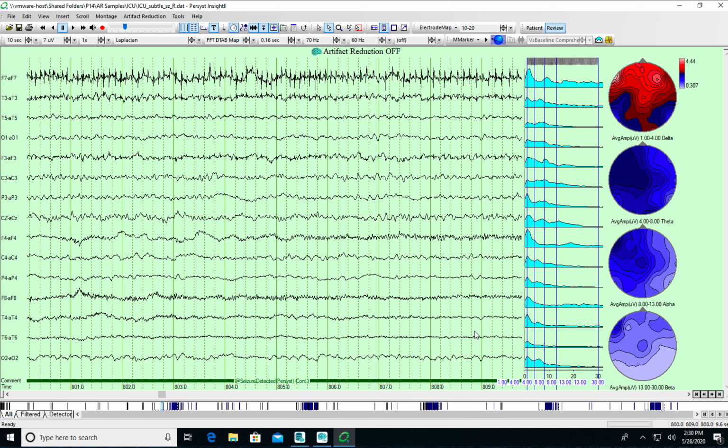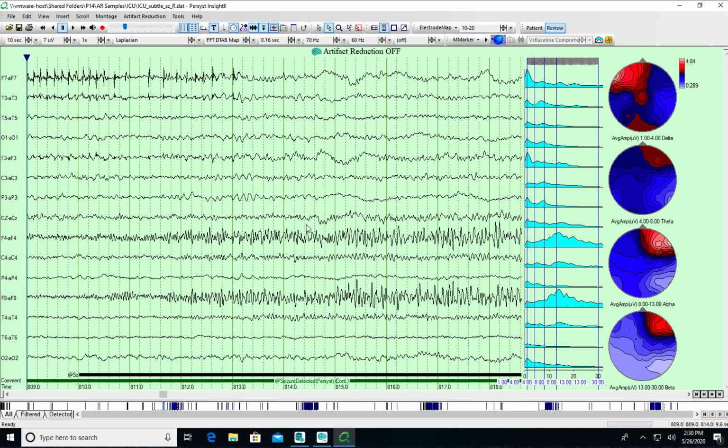Let's make a change to this. There's a couple of ways to do this. One is you can drop a range on the page and map that. So let's page forward a little bit on this. I'm just going to click in the scroll bar here and go to the onset. And let's say I want to do a shorter amount of time for this, and I want to move through it. There's a couple of ways to do that.